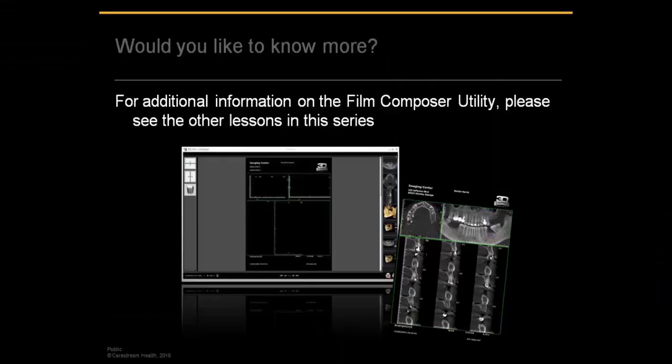This has been an overview of the Film Composer utility. For information on editing and modifying preset templates and creating new templates, please see the other lessons in this series.